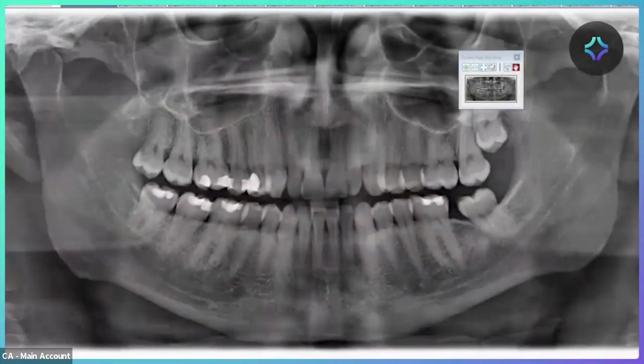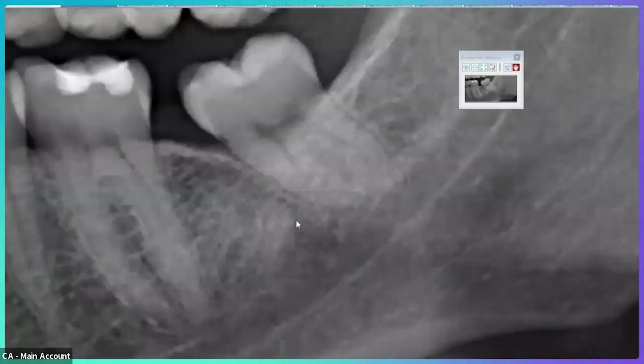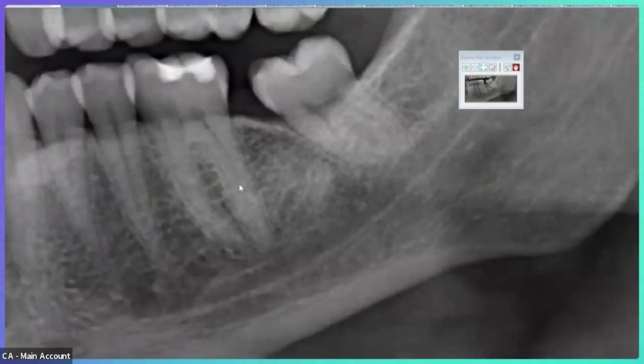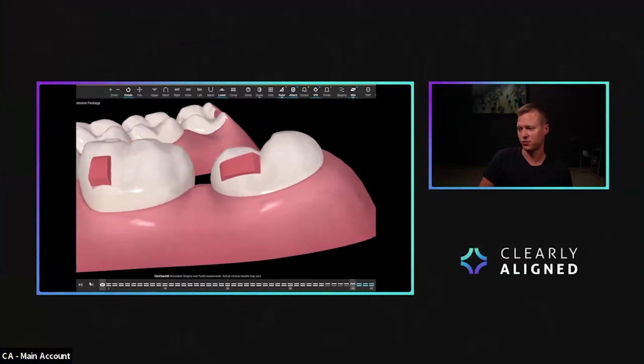especially when you consider the fact that there's even more dense bone to the mesial of this tooth. Right? Check out the sclerotic bone from where that second molar came out. So there's dense bone. So how do we expect that we're going to move this root? I don't know how many millimeters this is. Like the width of a molar is 10 millimeters. So this is probably 6 millimeters that we need to move this. How do we expect to move that root that quickly and be successful? And the reality is we aren't going to be, because it's moving too quickly.